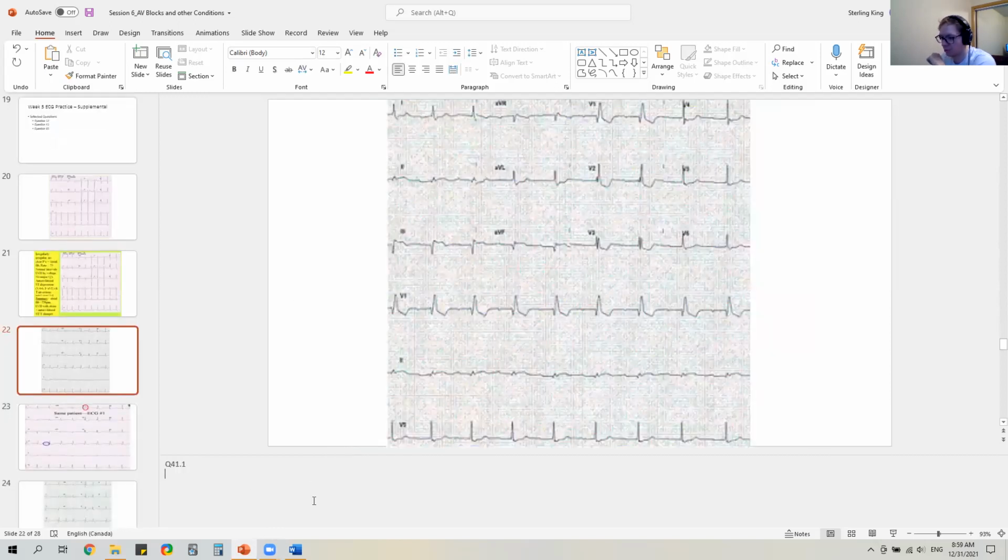All right, so question 41. So this is the first part. So go ahead and challenge it. I'm going to start over here. So let's check our rate. I'm just going to count it: 1, 2, 3, 4, 5, 6, 7, 8, 9. So 9. So it's a little bit more. I'm just going to say it's like 65 or something. I know it's higher than 60. If it's 9 over 8, it's going to be a little bit more than 60.